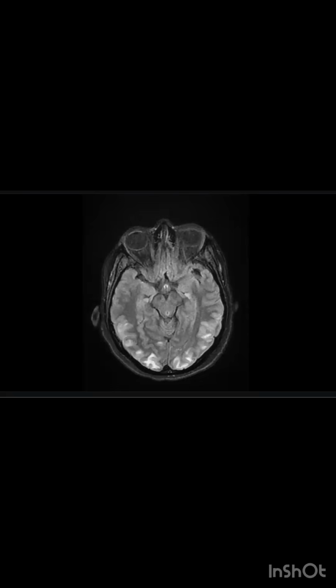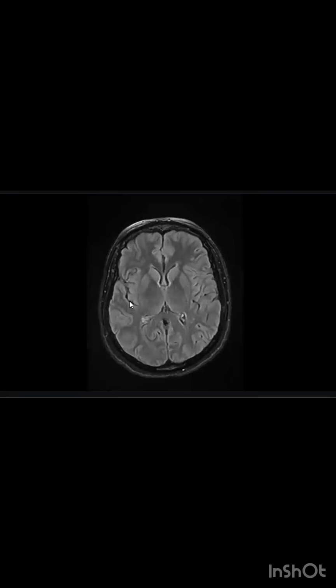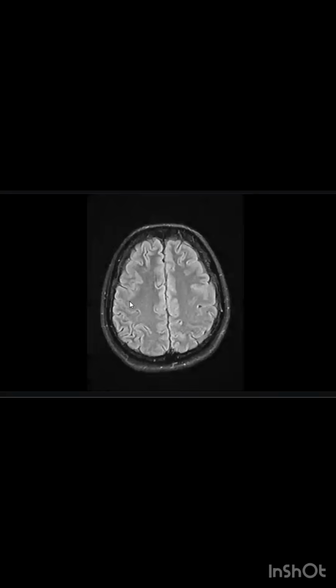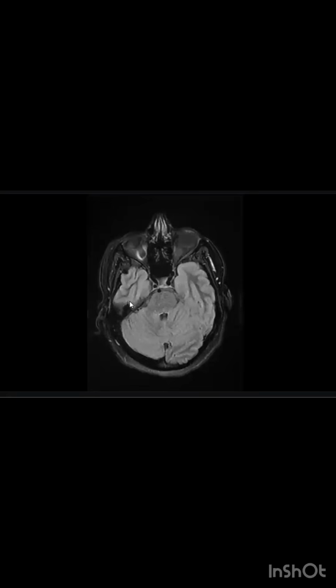By the way, they did follow-up for this case after one month, and if you look at the FLAIR images, it resolved completely. So it was confirmed as a case of PRES. Overall you did the case well and reached the diagnosis in just one to two minutes. Here we are learning how to deal with the cases in the exam. Thank you.